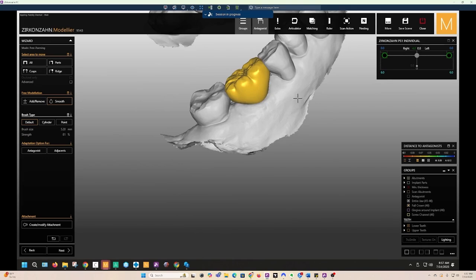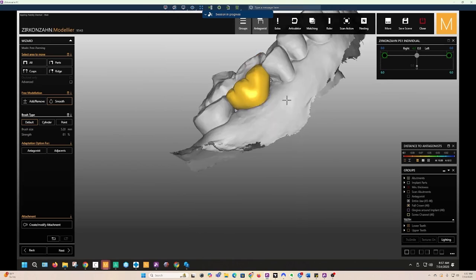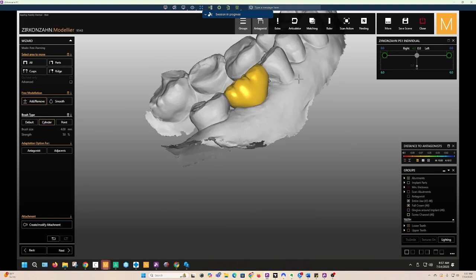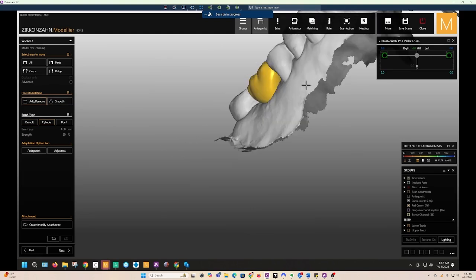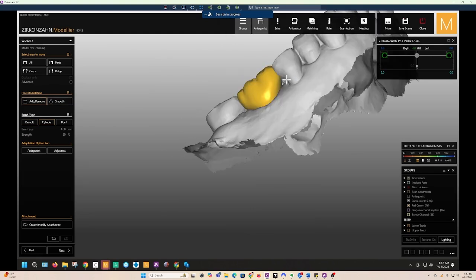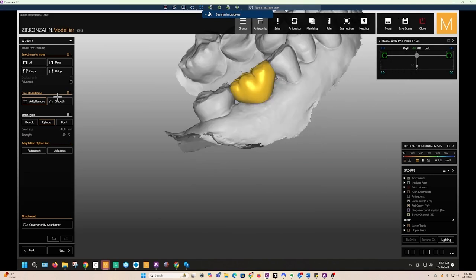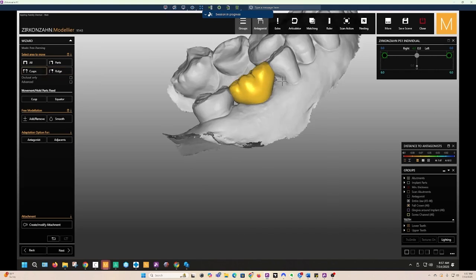I'm going to add, it's not too bad actually. Drag that out.